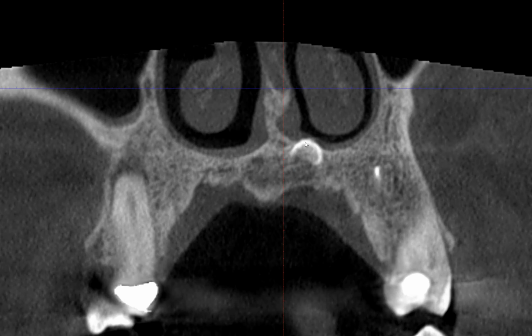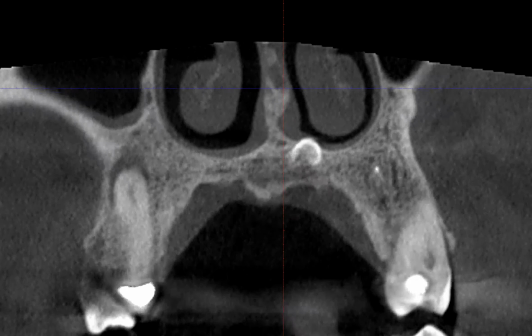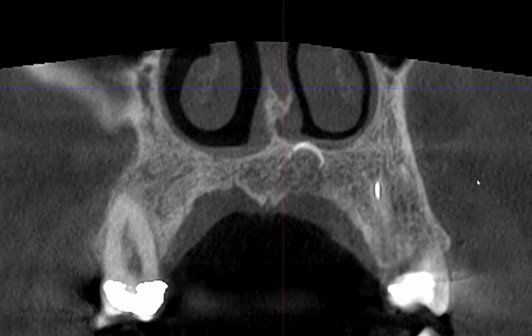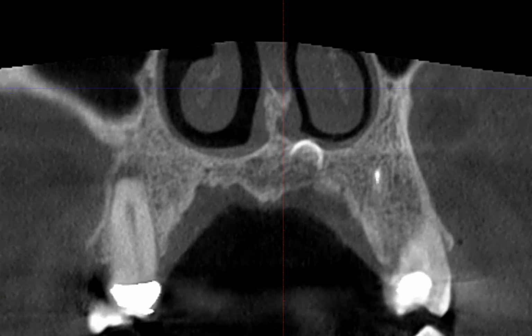area, which represents the enamel radiodensity. And you can see the dentinal radiodensity that is consistent with the root, and perhaps even the pulpal structures in that area. But you also see that there's not a full outline of the tooth, right? There it is, and then you lose it, and a lot of that is now replaced by the trabecular bone.